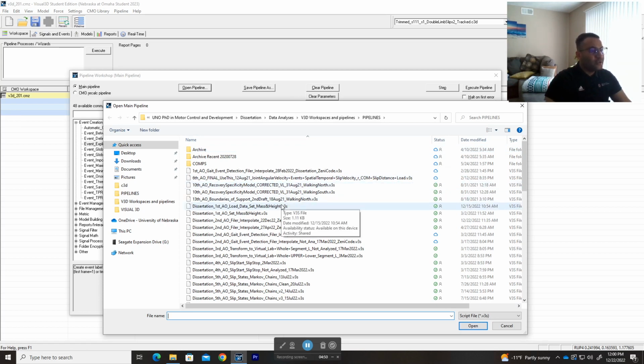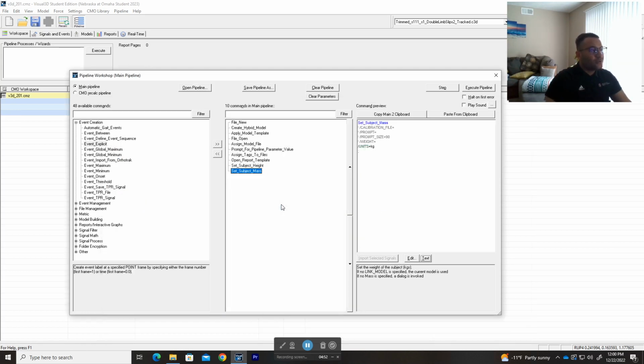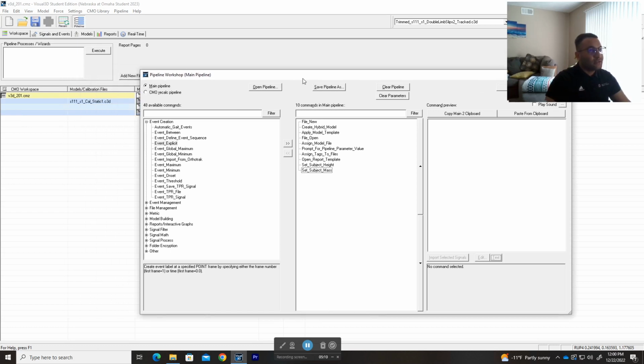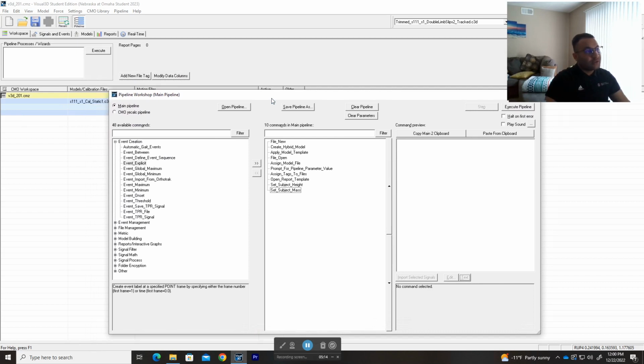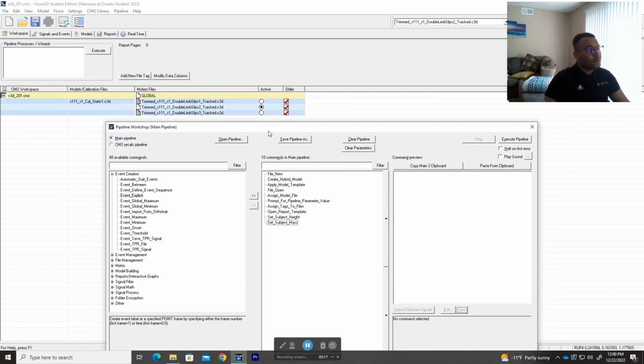I personally like to do things manually, just in case things get mixed together, especially if you're dealing with a lot of data. Things can get messy easily. But if you're starting a new project, this is a good tool to get you going, I guess.